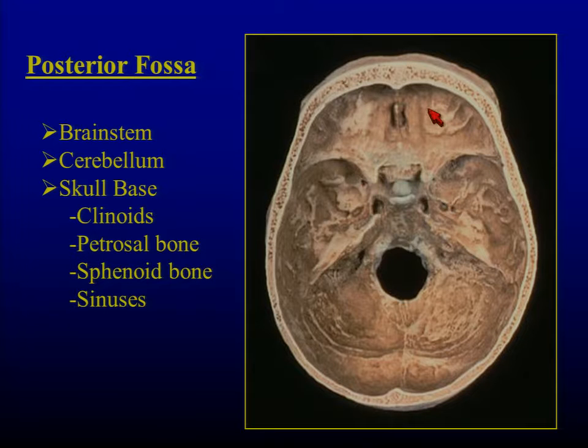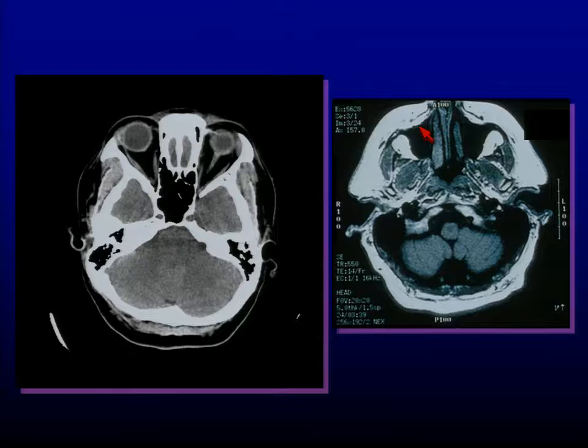And then as you look at the frontal fossa, you see all these kind of bumps and ridges. And again, in my deceleration injuries, when I'm looking for hemorrhagic contusion, if you imagine a decelerating brain slowing down really, really quickly, you can think of the frontal lobes just bumping across each one of these ridges as it comes to a stop and then sliding into the frontal bone. So those are the areas I'm looking for frontal contusions on my trauma patients.